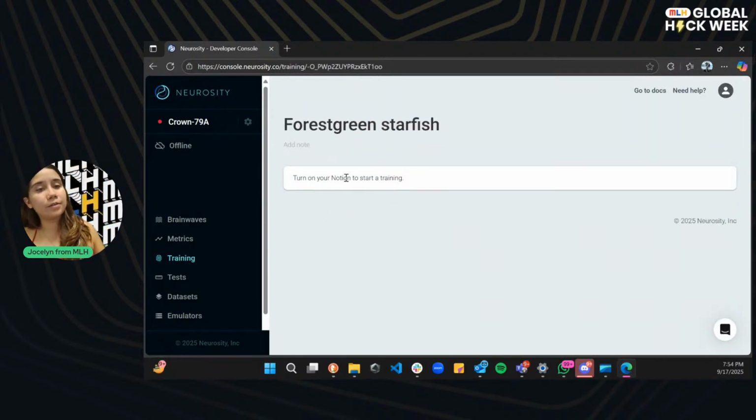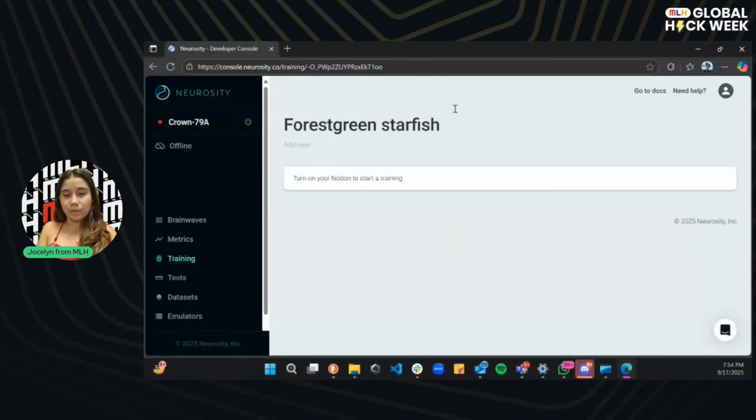But for that, I actually need to turn this on. So I'm still figuring this out, checking if I can install it somewhere else, and then just connect using what I have over here. So let me just see. Give me a moment.